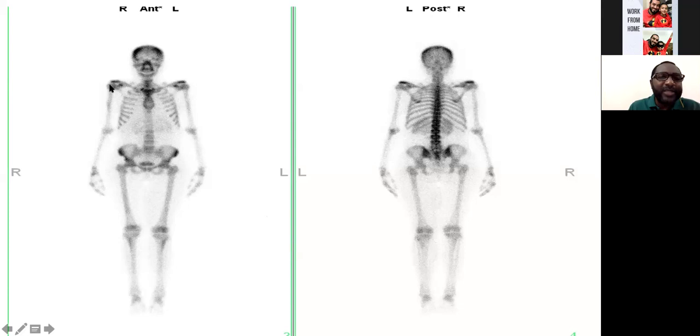All right. You can see the shoulder. Sometimes you can see the coracoid process. Again, because the coracoid process is more anterior, it is more intense. And whatever you see on a bone scan, the advantage of a bone scan is that you have the right and the left to compare. So they should always be symmetrical. If you see an uptake on the right that is also on the left, that uptake is not likely to be a pathological process. If you see an uptake only on the left-hand side and it is not projected on the right-hand side, you need to be careful and look for more views. So you always have the right and left to compare.